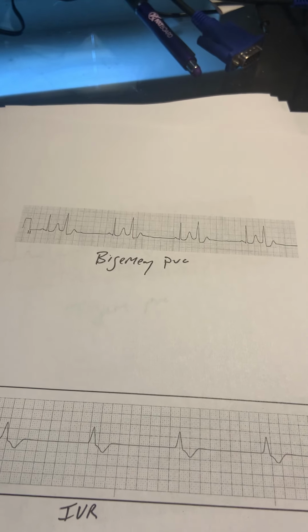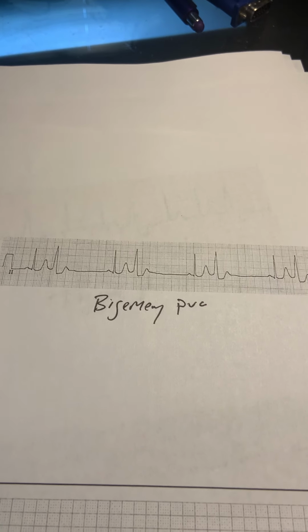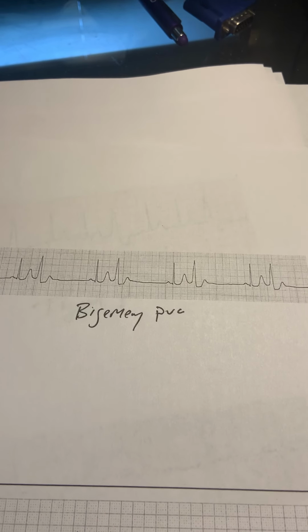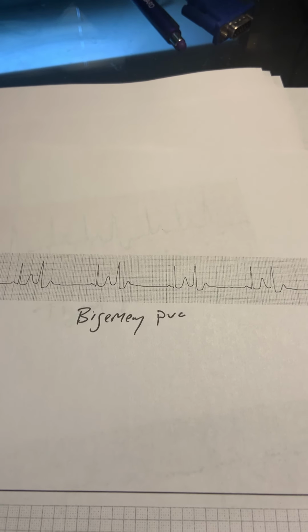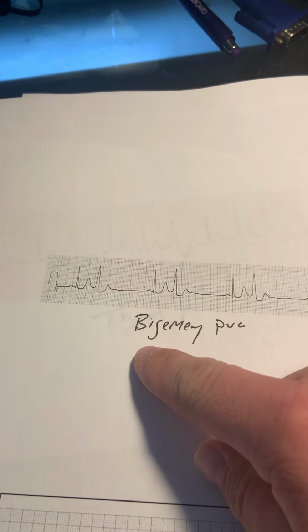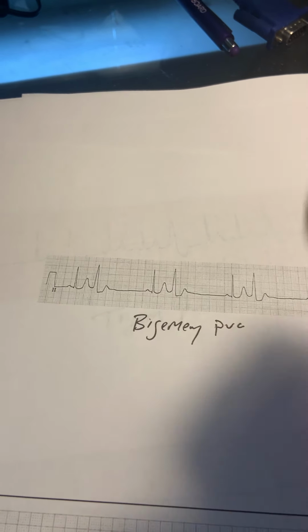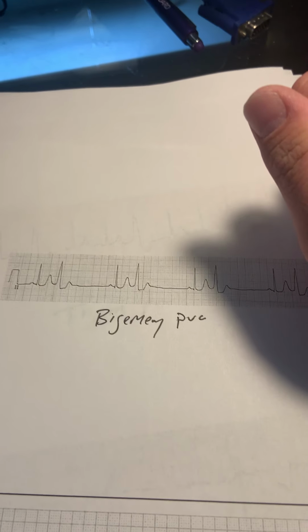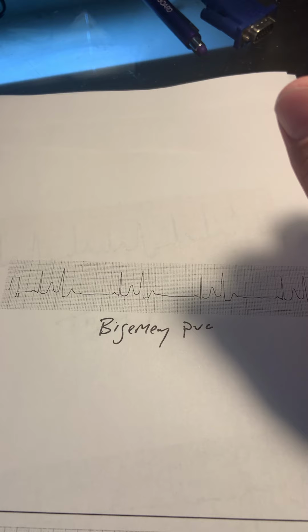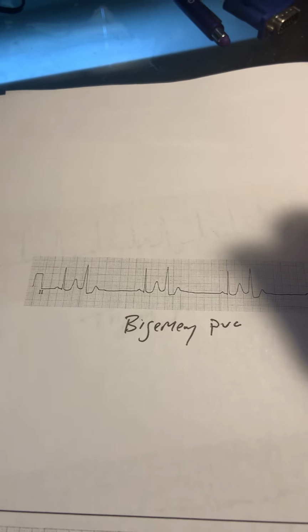But if you've got them on a cardiac monitor, and you also have your SpO2 probe on, it's detecting your perfusing rhythms, okay? So you may see a pleth line one time here, but not here. And you might see it here, but not here. And then if you palpate their pulse, you might notice that they are at a rate of 40 instead of 80 like you thought. And that's because sometimes those PVCs aren't perfusing.